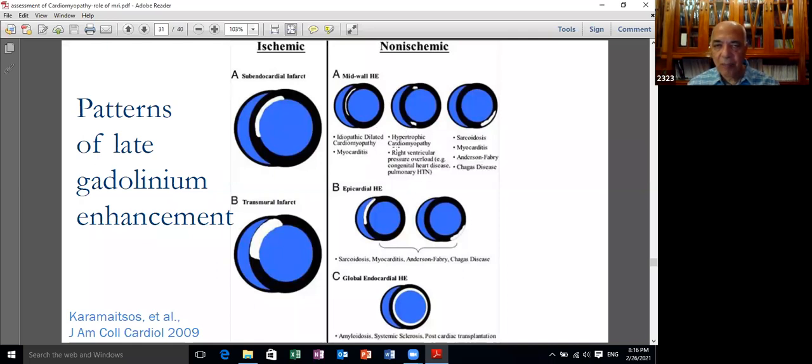Areas that show hypertrophy in hypertrophic cardiomyopathy show diminished contractility and show fibrosis by MRI. And again, you get delayed enhancement in areas where the right ventricle gets inserted into the left ventricle.